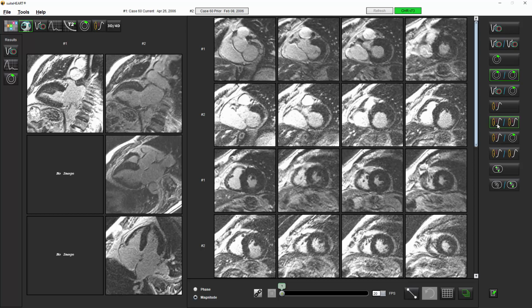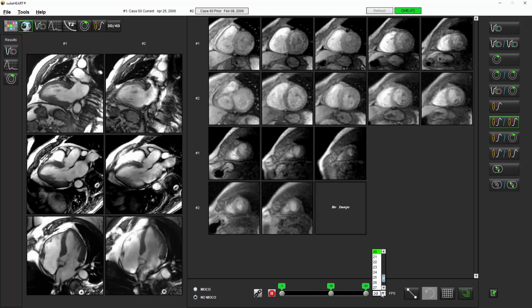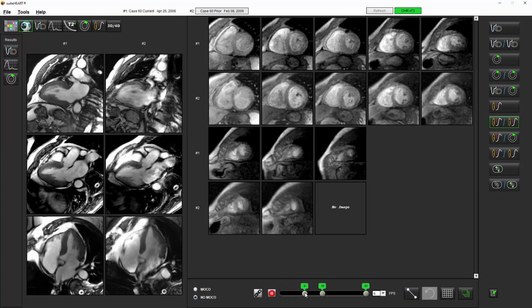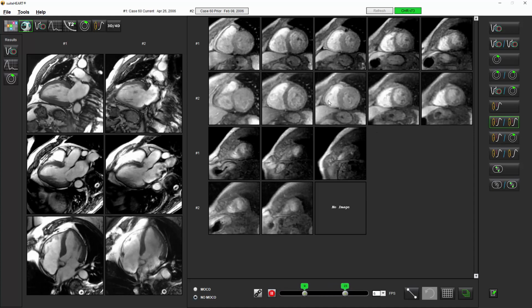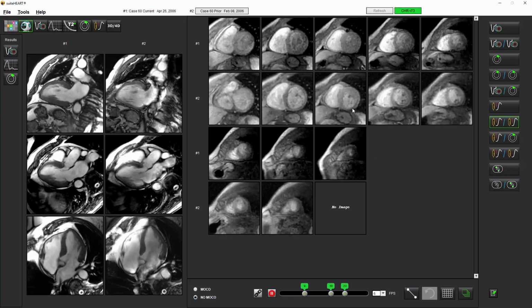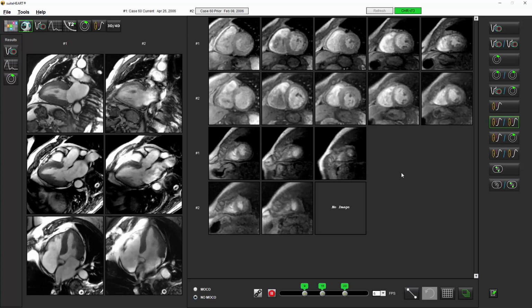And if we compare the old perfusion images, which we can see here, and I can slow these down a little bit, and maybe limit it to the first pass here. What you can see here is that in the old study, again, number 2, you can see there's an area of even resting ischemia, which is not present in the new study after revascularization.